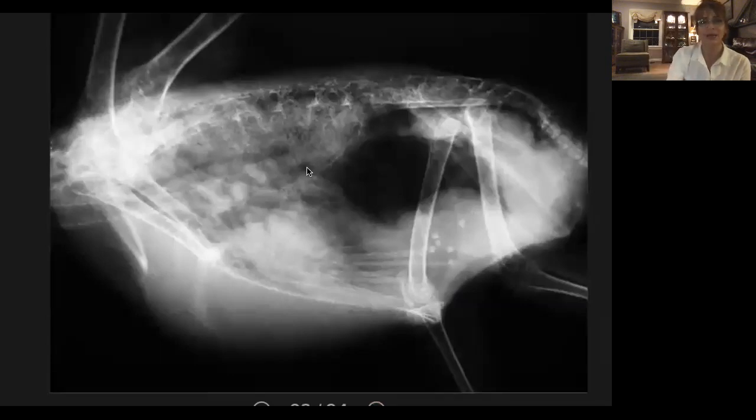So this is a bird that has pneumonia, and if we look at all the little honeycombs once again, here, this all looks kind of normal. They're all about the same size. But then that whole honeycomb area, that pattern becomes just obscured. And if you think about the way that they develop, the type of pathology that you see in the lungs where they have little granulomas, those airways are just obliterated by little tiny abscesses, basically. So you lose that honeycomb pattern right there, and it tends to be patchy.